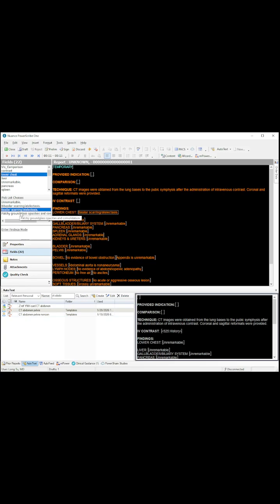To select them, you can just double click on any of these. You can also say pick 4. You can pick 1, pick 2, pick 3, pick 4 to select whichever one you want. Pick 1, pick 2. As you can see, the voice command can be a little bit delayed, so sometimes I just click.